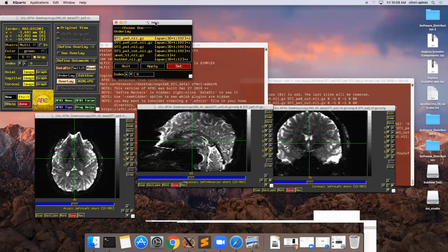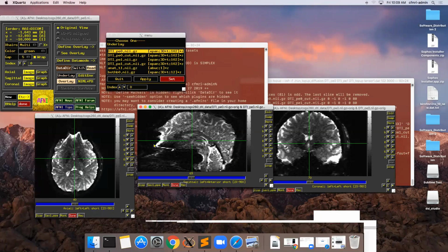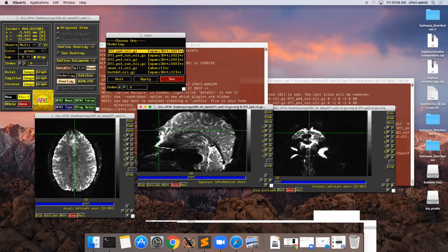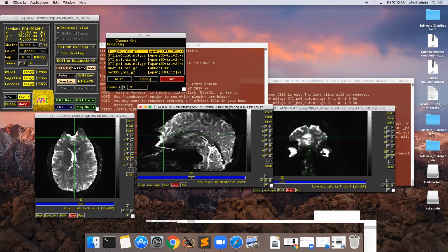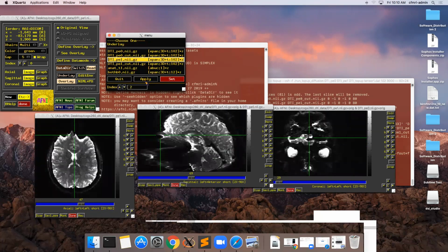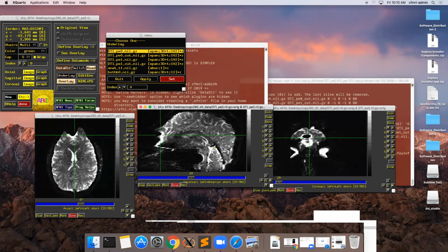But this is our PE0, so in this case, that is what we call forward, and you get this sort of stretching at the front of the brain. Kind of depending on where you are. In some places it might look a little smashed, but when you compare it to the other, PE1, you can see this one's much more compressed to the front of the brain. And they're very distorted, really, in this case. I mean, if you look at this data set, I think this might actually be my brain. It's not shaped like that. I don't have like a point at the front of my head.